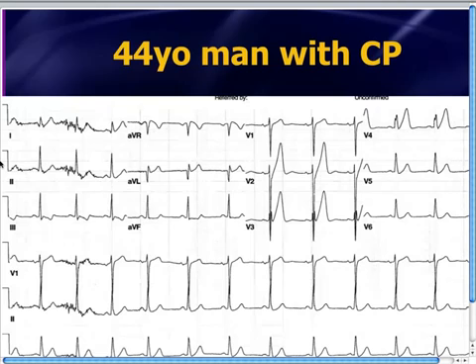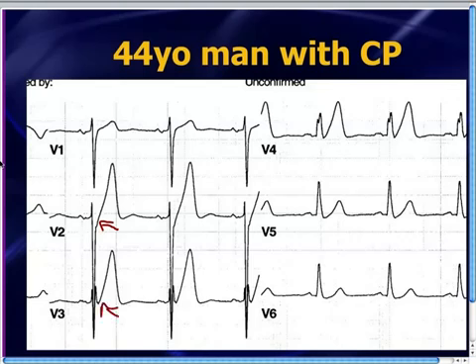The DeWinter abnormality will go to the precordial leads once again, and this is a very classic example of the DeWinter T waves. Once again, you've got J-point depression of anywhere from 1 to 3 millimeters. In a couple of these leads it's only 1 millimeter, maybe 2 millimeters, maybe even 3 millimeters in lead V2.